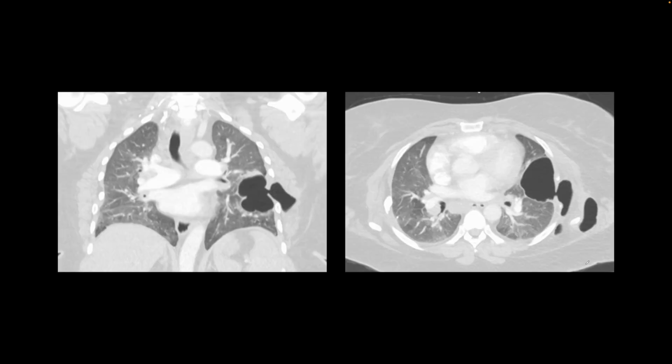This is our next patient, and here we find that there is a loculated pneumothorax, and we find that a part of the lung is herniated outside the chest wall. See here, we see more focal air outside. Maybe they've had an intervention because that can lead to something like this. So a herniated pneumothorax, a rare complication for which the treatment is surgical.